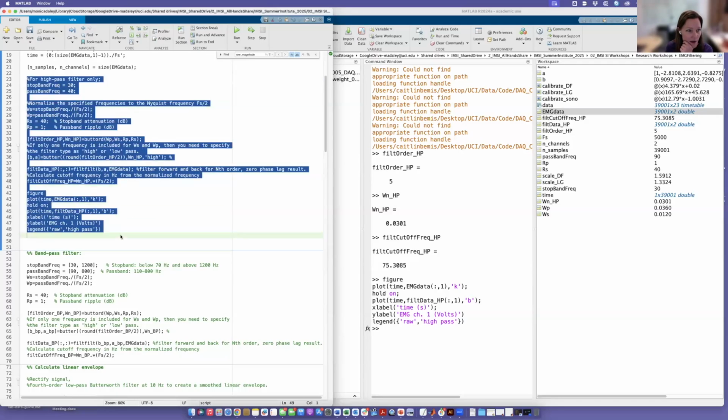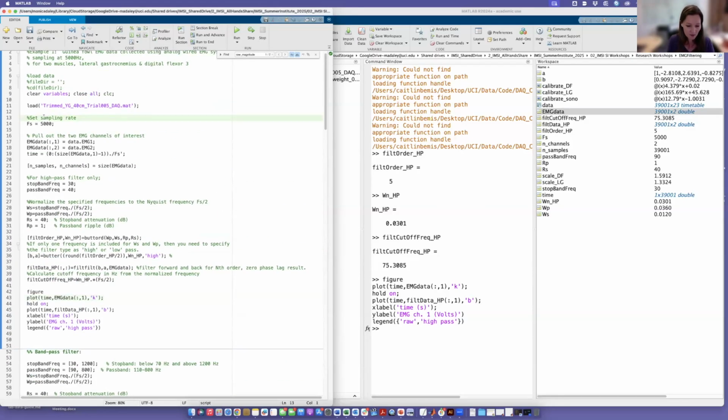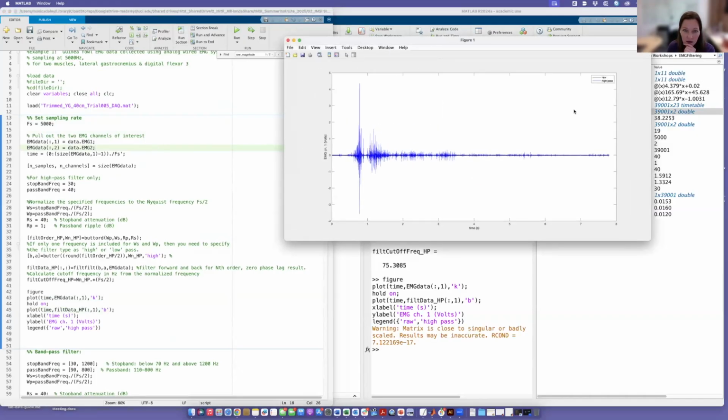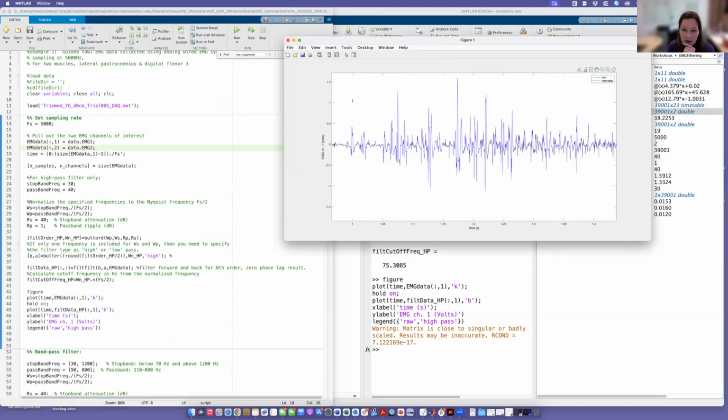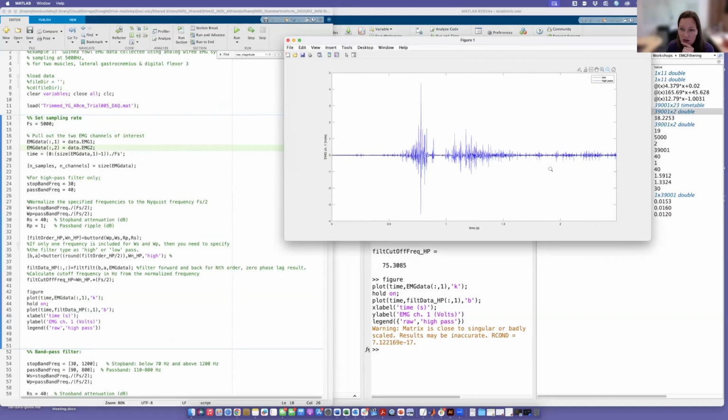And we can go and just rerun this. I'm going to just make this part its own section, right? So we can rerun this section with different filtering settings, okay? And okay, it still calculated the result in this case, so that's good. If you zoom in, you'll see that this one looks even more similar to the original. There's even less difference between the original and the raw data.